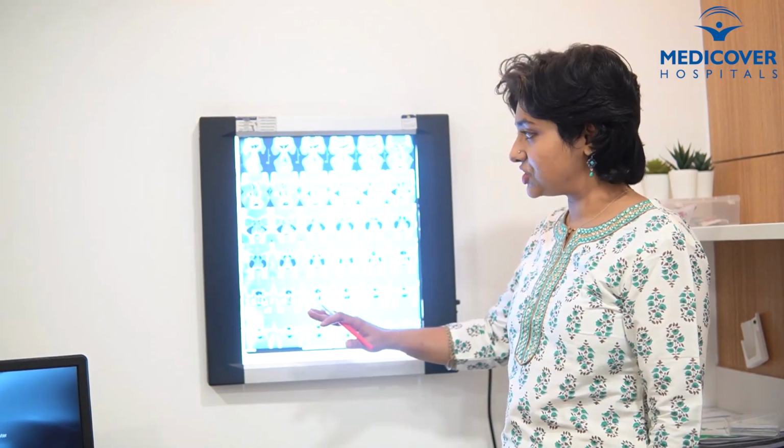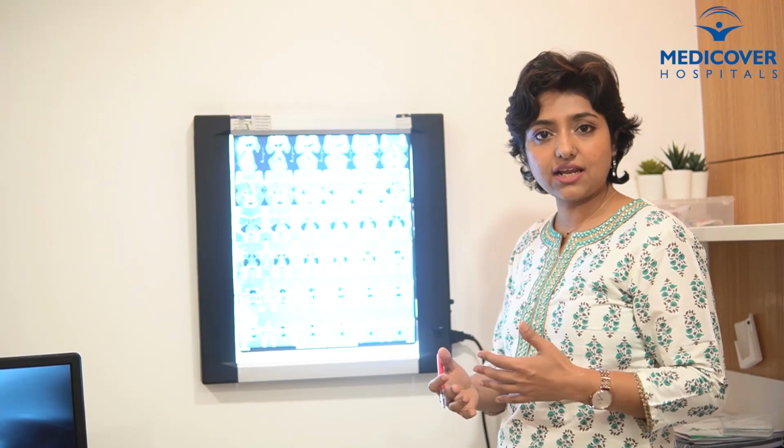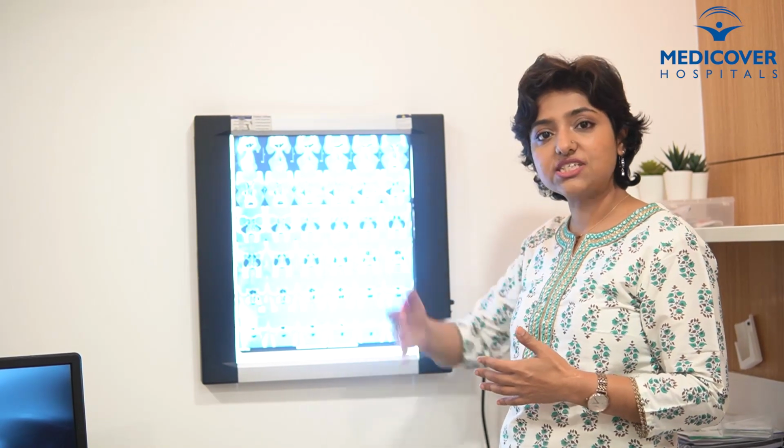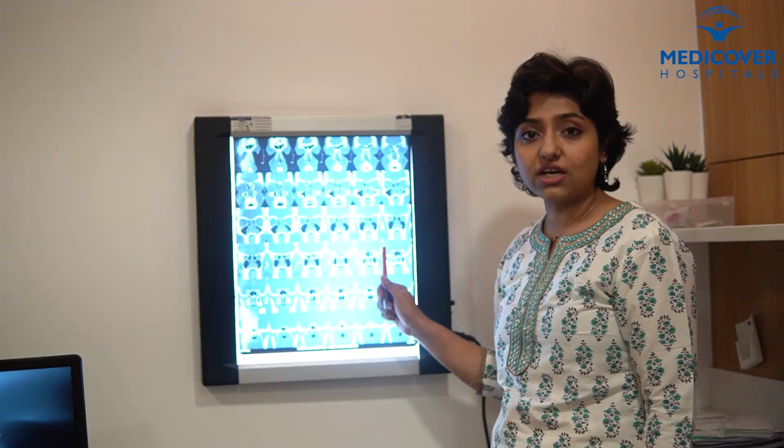Now the CT scan machine takes pictures of the skull from different angles and takes multiple small slices. The cuts you are seeing here are called coronal cuts. What is a coronal cut? So this is the face. Imagine you are getting slices of the face like this, in this orientation, that is a coronal cut. If the cut is taken like this it is axial, and if it is taken like this, it is called sagittal. I will describe today the salient features in the coronal cuts.